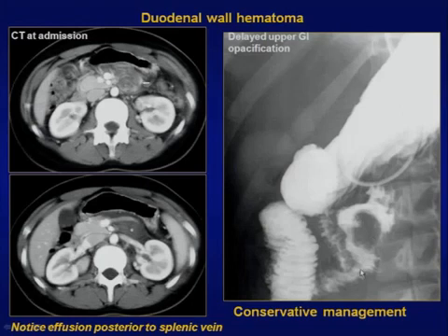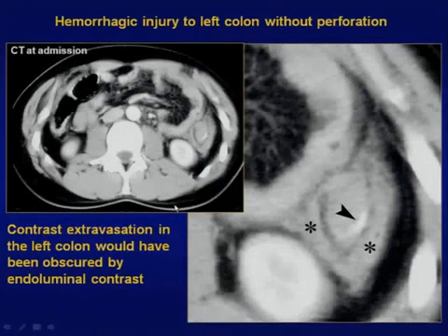In this other example, from the colon, you see bleeding here. Is it post-traumatic bleeding? The patient got an injury to the flank, and if you had opacified this colon before, of course, you would never have seen the hemorrhage inside the colon wall. And here you have pericolic effusion in this patient. So no more oral contrast is given.